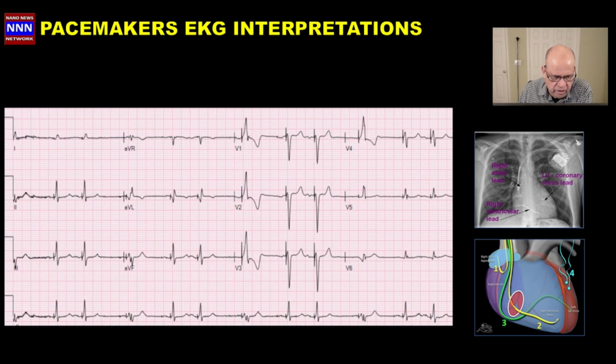Let's move on to the next electrocardiogram here. We have an atrial sensing here. We don't have any atrial activity, and here I see an atrial activity, and the atria is activated. The second time the atrial beat comes earlier, so this could be a premature atrial beat, because if it was a regular beat, it probably would not have come on time and we'd have seen an atrial activation.